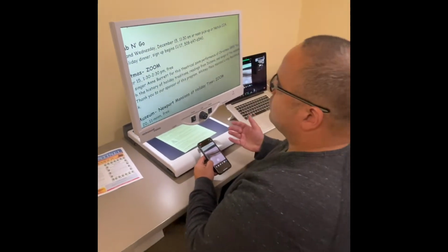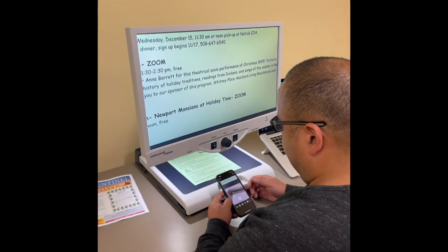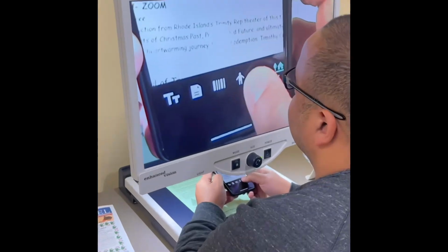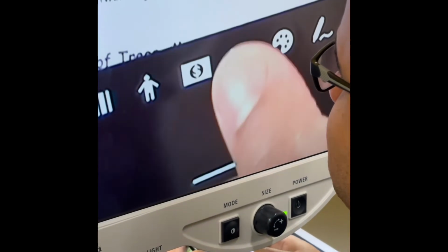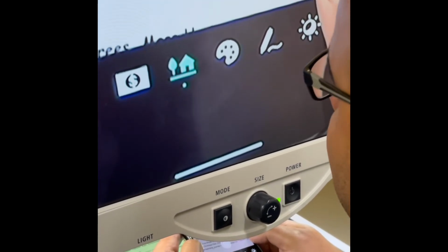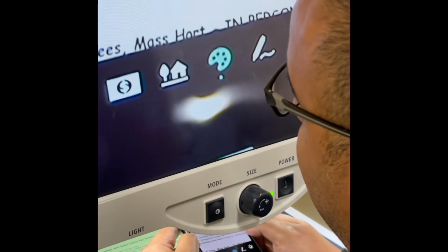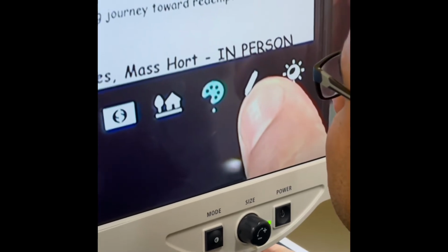And obviously if you're using VoiceOver, you can double tap and navigate these things. All of these buttons are going to be actionable. So the camera button was in the center, you could just double tap that. Okay, I'm going to go to the next button. We did currency, we did scene. Now I'm going to swipe left here. If you're using VoiceOver, you swipe up to move to the next item. Scene preview. Color gray. So that's how you would use the color tab.